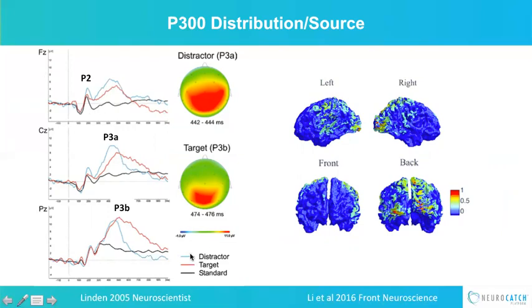basically the sensory processing and the P300, making the point that there are actually different types in the P300 family. So I want you to pay attention to this P200. This is a positive going peak at 200 milliseconds. This is what's called a P3A, so it's a variant of the P300. This is another variant called the P3B. This is kind of the classic P300 you see. So this is the one we're looking at in terms of a target, this red one.